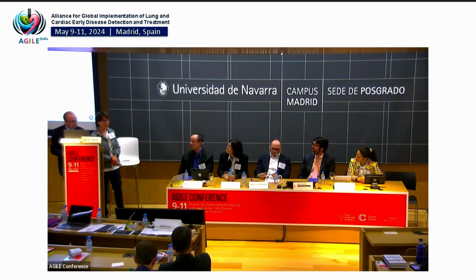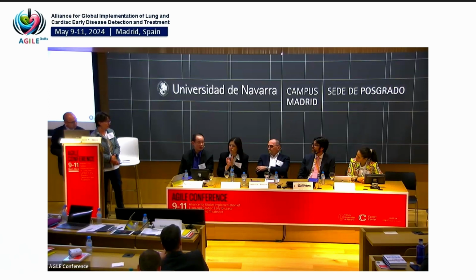So in the first case, the 2 patients that I showed, what would you have done in this case? I think those were smaller than a segmental or lobar consolidation. We've seen a number of adenocarcinomas that can look just like that, an oddly shaped area of subsegmental ground glass, which I think both of those were. So I think it would be very reasonable to first ask, do they have any signs or symptoms of infection? In the absence of that, my suspicion would go up higher, and we'd probably do a short-term follow-up CT in 3 months.